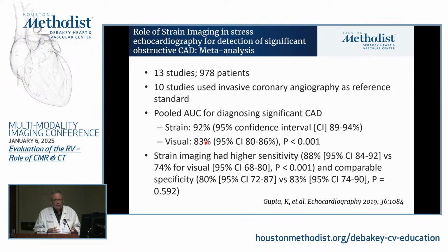Very nice quality images. For the sonographers, you could, because dobutamine stress is not such a hard test to do, you could do some strain. When you're doing dobutamine, you get your peak stress images. And since you have about a minute and a half of post-stress ischemia, once you're done with the regular 2D imaging, you could switch to the strain and see if you could detect some abnormality. But you need to have some really nice quality images.